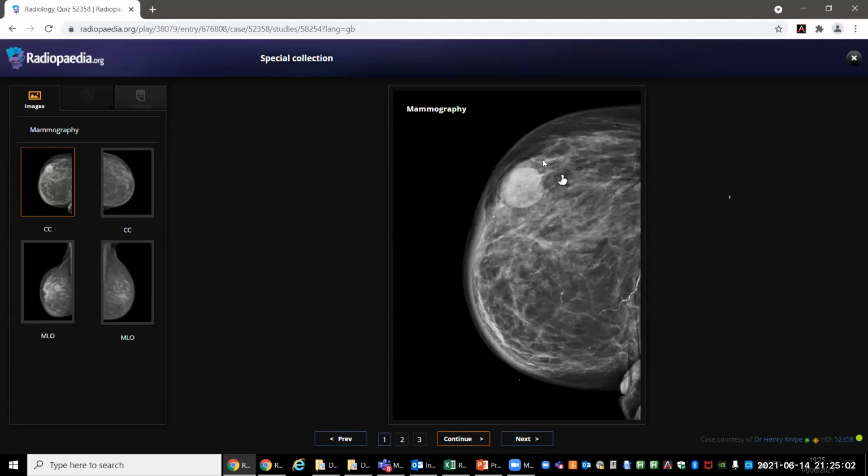It has a halo around it. It's well defined, so it should be M2, but fine. It's okay to say I would like to still take a look with ultrasound to confirm my findings of it being benign. So that was a cyst, a breast cyst.